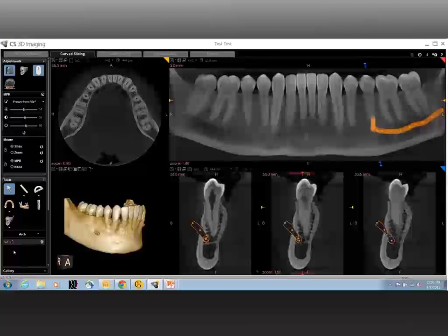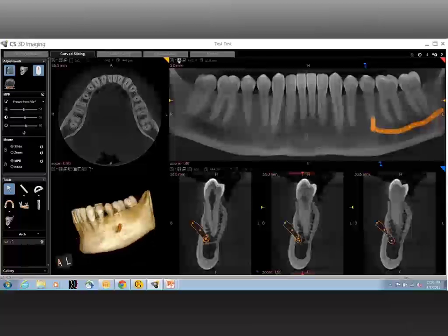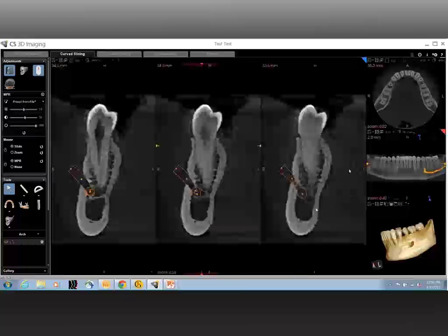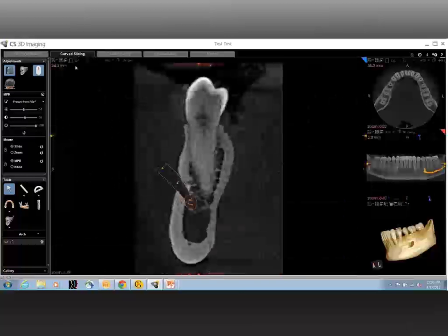Well, the answer to that question is a little more than just one sentence. When you visualize anatomy and when you look at a two-dimensional radiograph, let's not forget that a two-dimensional radiograph is nothing but a two-dimensional representation of three-dimensional anatomy, which means that one of the dimensions is missing. Now, that dimension is the depth. If you directly compare a panoramic radiograph to a three-dimensional scan, that relates to buccolingual anatomy, which is essentially the depth.